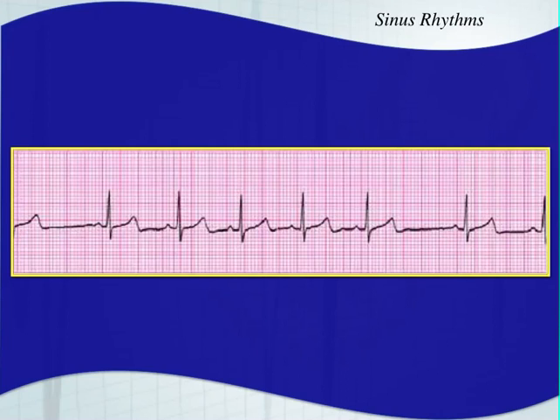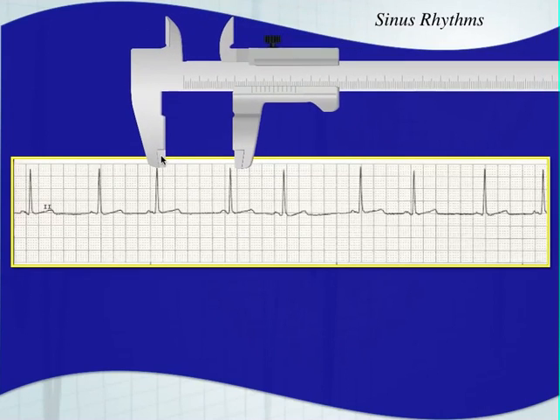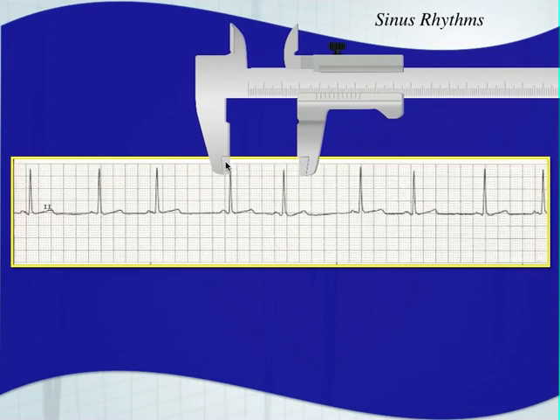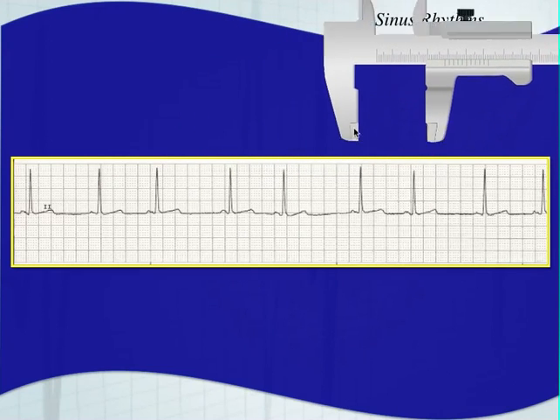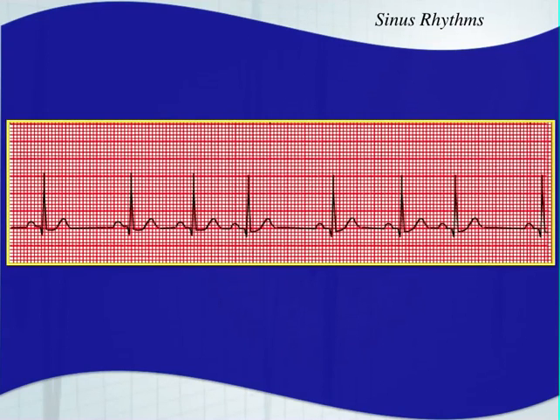Okay, let's take a look at another EKG as soon as it pops up. And here's another example where everything looks like a normal sinus rhythm. It just looks irregular. You'll notice that your R to R intervals are not staying consistent. They are all over the place. All right, they change with the respiratory pattern. Here's another example of sinus arrhythmia. All right, take a look at another example here. Again, this is sinus arrhythmia. It just looks like a normal sinus rhythm, except it's irregular. So we just call that sinus arrhythmia.